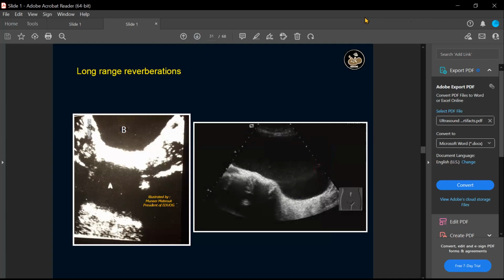Think about the case. Who is the obstetrician here? Raise up your hand, the obstetrician. Excellent. Look at this. I will give you a history here. I think this structure looks like a cyst, but let me tell you the history.